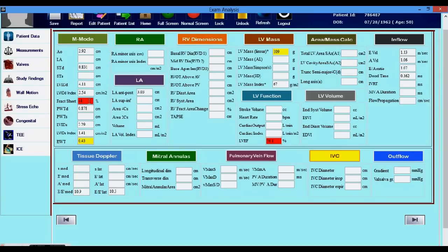These values can also be modified at this level by simply typing in the field. When placing your cursor over the value, a pop-up tab will indicate the normal value.